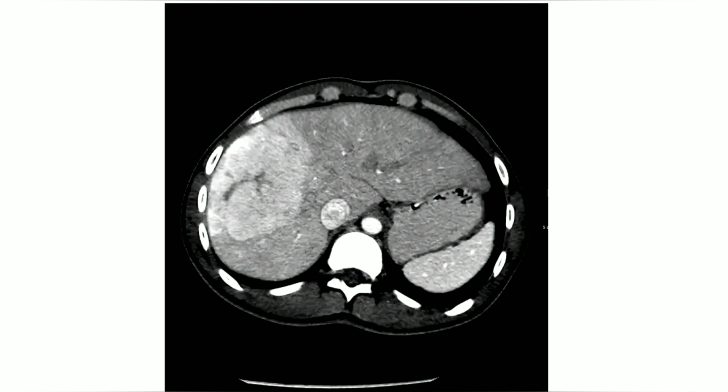in arterial phase. I would like to see the other cuts and sections of the CT liver triphasic protocol to further characterize this lesion, and also correlate with the ultrasound images. Okay, we don't have ultrasound images. I'll provide you with the triphasic, but first, what would be your differential diagnosis?